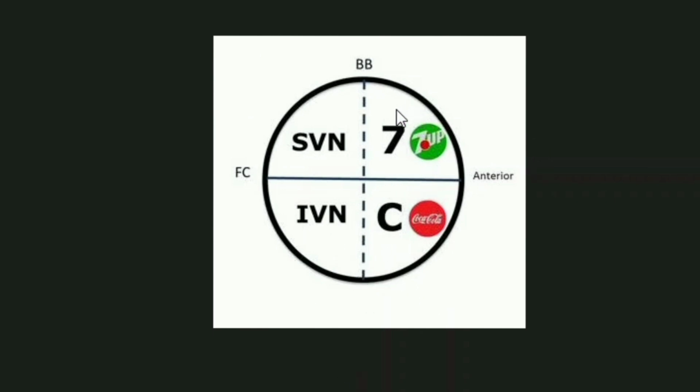Here we can see this is the facial nerve, which is present along the anterior and superior aspect of the internal auditory canal. Just below it is the cochlear division of the vestibulocochlear nerve, and posteriorly is the superior division of the vestibular nerve and the inferior division of the vestibular nerve.